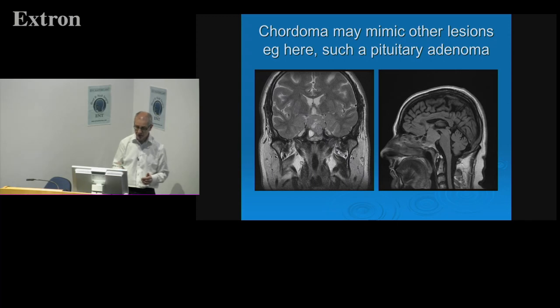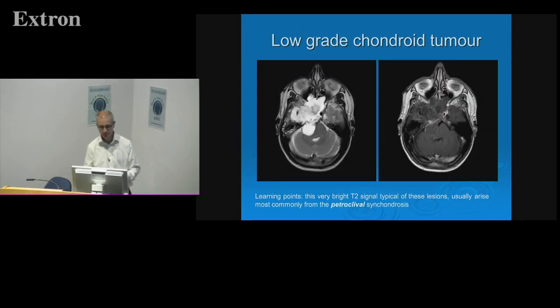Sometimes they can look really quite different though. This one was initially reported as a pituitary macroadenoma. You can kind of see why. There is very little difference in terms of imaging appearances.